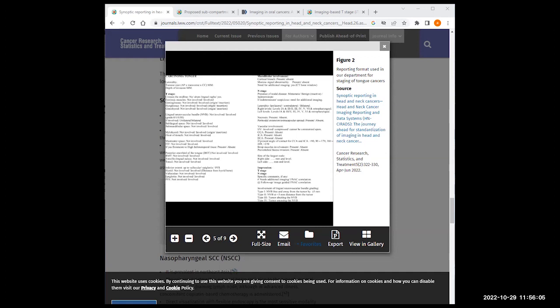The lingual raphe, and the lingual neurovascular bundle, NVB, which I discussed in the 4 grades: you can tell whether it's involved or uninvolved, and if you're not very specific, you can give the grade of involvement. Then it's important to document the floor of the mouth involvement, that is the sublingual and submandibular space involvement, and whether the mylohyoid muscle is involved or not. Then go on to the masticator space, which is advanced disease.